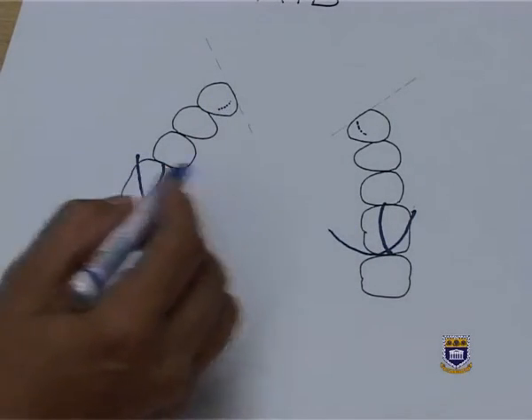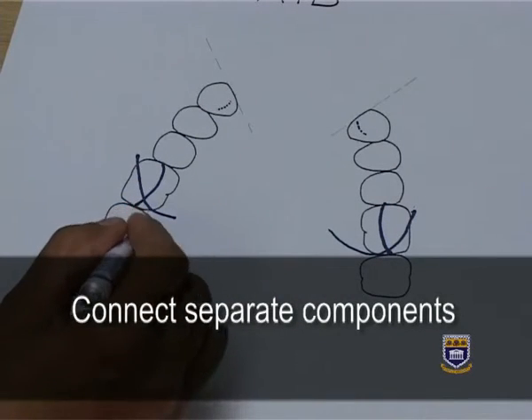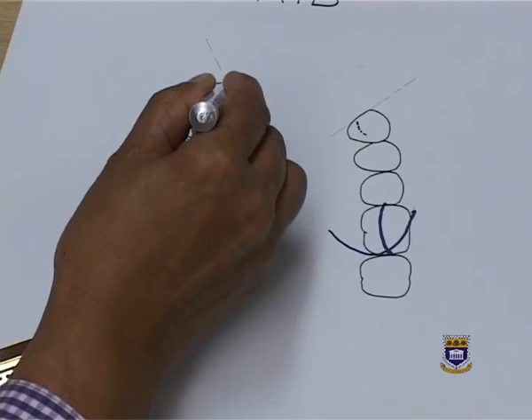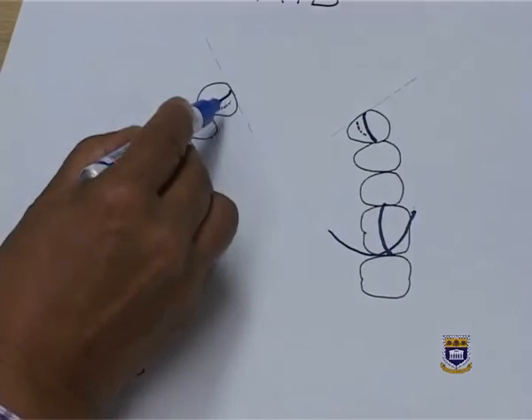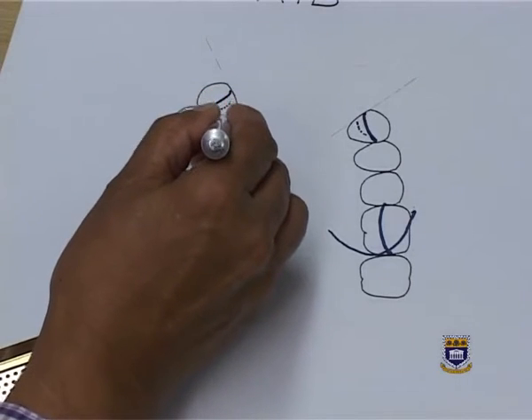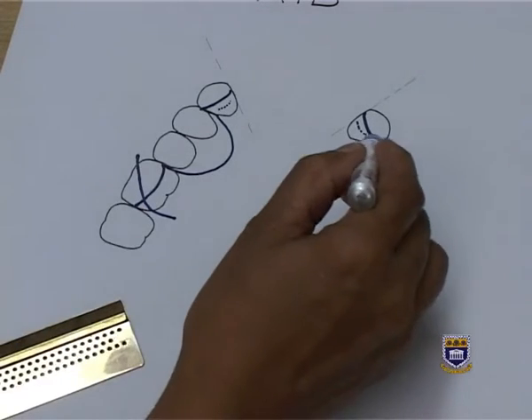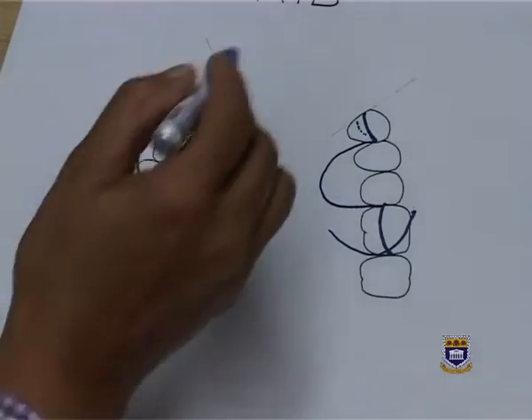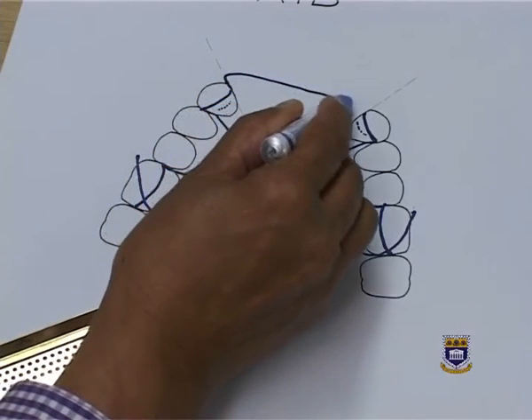The 5th step is to now connect the denture so that the dental technician can see what he or she must design. Because I've got a cingulum rest, I'm going to have to cover that, because my preparation will be on the lingual surface of the tooth. Because I have 2 teeth, I can actually relieve the 2 teeth, connect it with my plate. I will do the same on the second quadrant. Okay, so I'm busy connecting the components, drawing my partial denture.